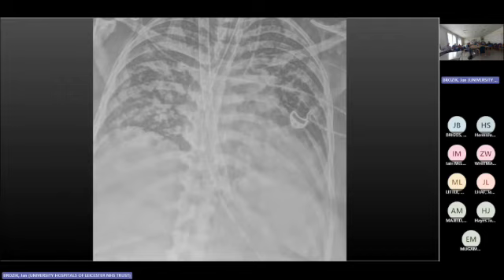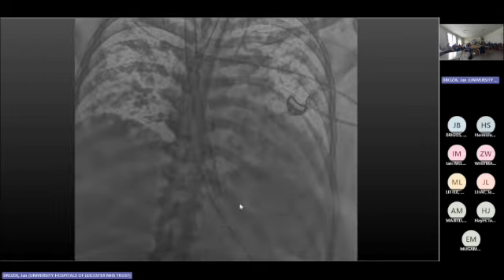Or is there anything you're a bit unhappy about with the ECMO cannula? Everyone is happy. Yeah, it's in. That's what we want. Yeah, and it's working. I know radiologists don't know how the ECMO circuit works and how to operate it, but you can obviously check if there's a good flow, and if that cannula goes into the hepatic vein, it might not work as it should. So you check the imaging, it might correct it. It was working beautifully.